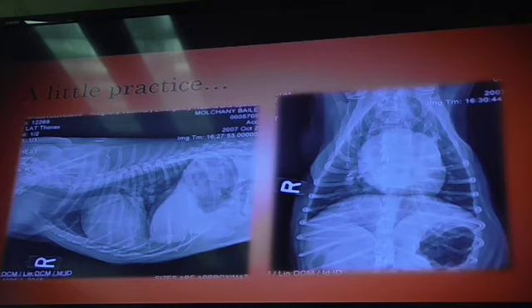So that line there. Okay. So, can everybody see me? I'm going to go back to the computer, but I'm going to stand right here. Which opacity do you think this is? What part of the body? Good job. Okay, I'm going to repeat. Y'all heard him? On this side? Spine of the scapula. That side.